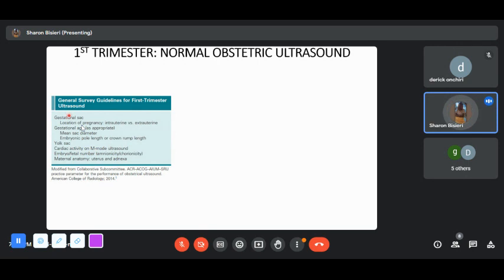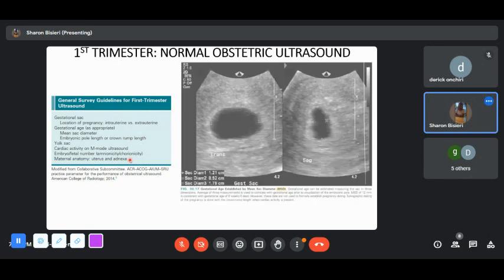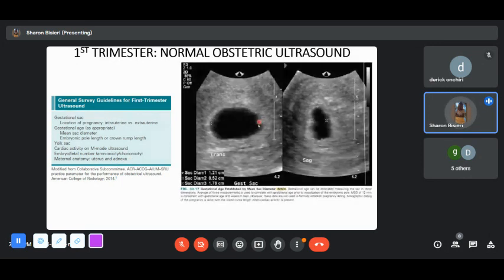And then after identifying the gestational sac, we need to tell apart the number of embryos or fetuses that we can see, and its amnionicity and chorionicity. Then after that is done, we also are supposed to assess the adnexa. So this image to the right is showing how to calculate the mean sac diameter.